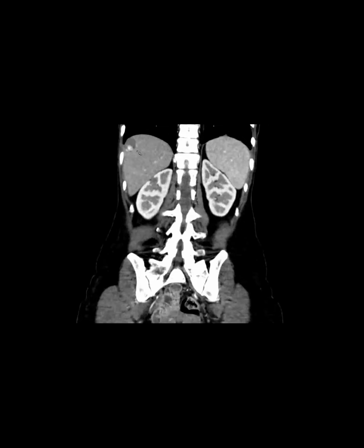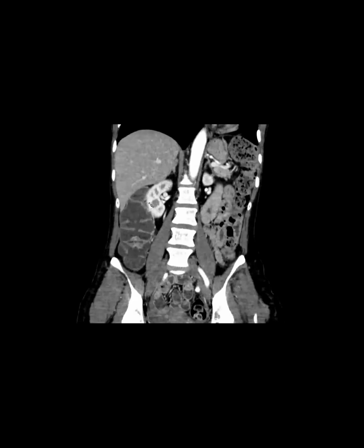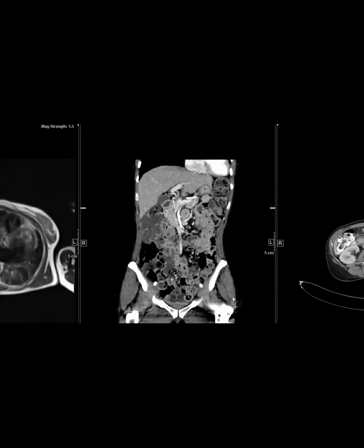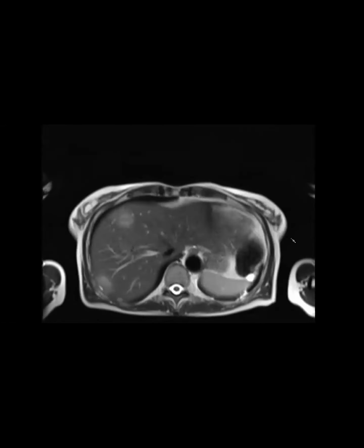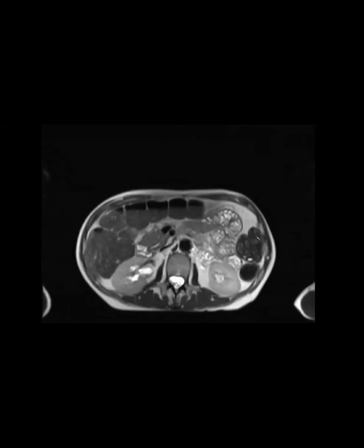This guy here. I mean, I think hemangioma is definitely a consideration, and I would probably want an MR. Good, excellent. That's basically what we said. And this is the MR. They don't look like hemangiomas. Yeah, exactly. Not typical hemangioma.